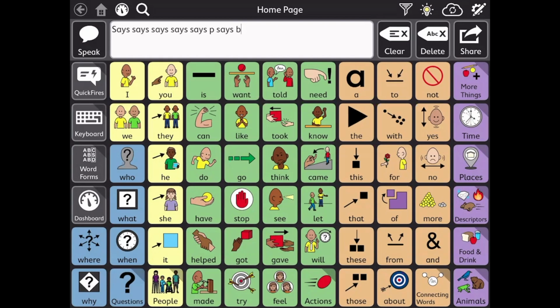So I highly recommend that you work with a speech pathologist, but hopefully this video will give you some background into this app and whether or not it will be something you'd want to consider for your loved one. Okay, let's check it out. So here is the front page, or the home screen, of MotorPlan 66.